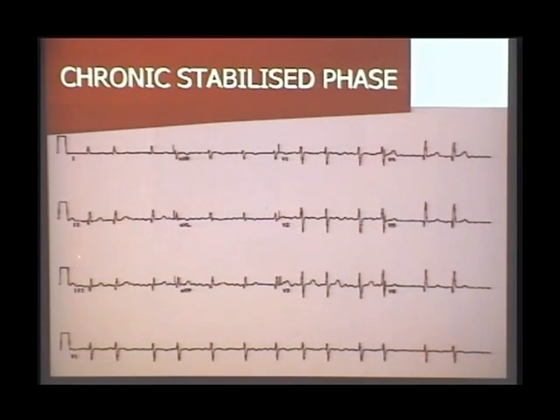You can see it in this ECG, in the inferior leads. Single sentence diagnosis, quick. Chronic stabilized phase, okay. Chronic total occlusion of RCA. You can see that the pathological Q wave is there, the ST is normal, and the T wave is normal.